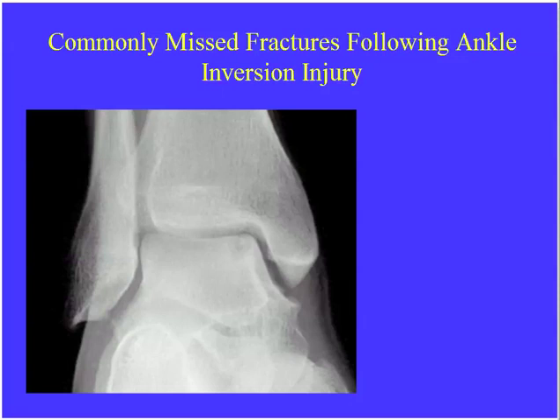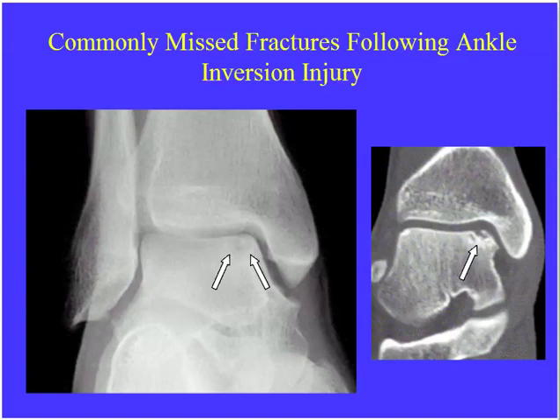Number one is the lesion of the talar dome. They show you an AP view of the talar dome. Look very closely for any kind of a lucency underneath the talar dome cortex. We can see it nicely on MR and on CT.